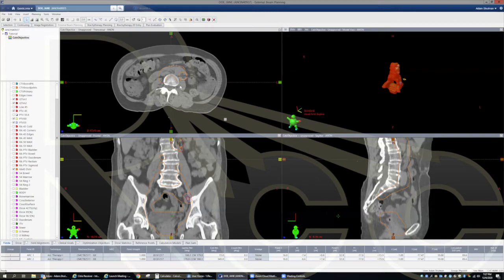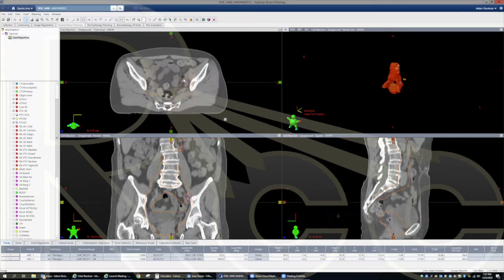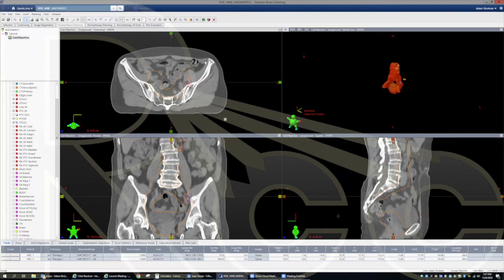And that way, in the optimizer, the whole idea is to have no conflicting arguments in the optimizer. And so if I'm abutting 45 with 55 down here, what's going to happen is that tail of the DVH, we won't know if those higher doses are all close to this structure, or if they're just sprinkled out throughout the structure everywhere. So in order to say that we want the highest doses just surrounding here, we'll subtract out a little bit of the margin.